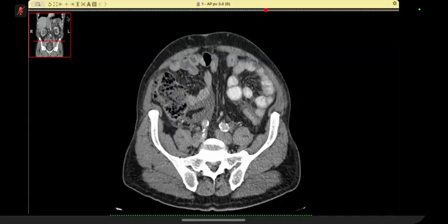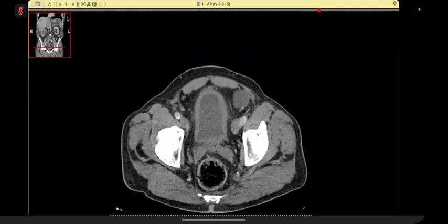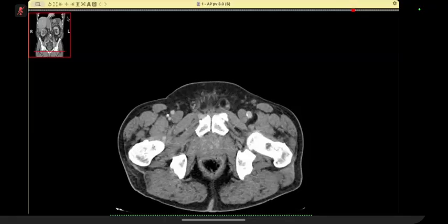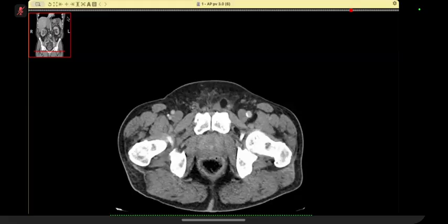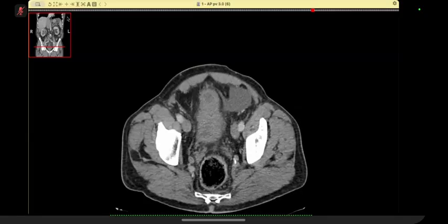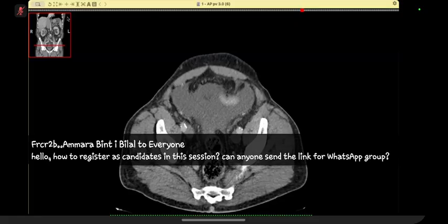The thrombus also appears to extend below the renal level into the common iliacs. But I would like to correlate my findings with Doppler study as well to check if there's femoral extension of the tumor bilaterally. So in summarizing, this is a right renal neoplastic mass extending into the IVC with tumor extension superiorly into the heart and distally till the bilateral common femoral veins.